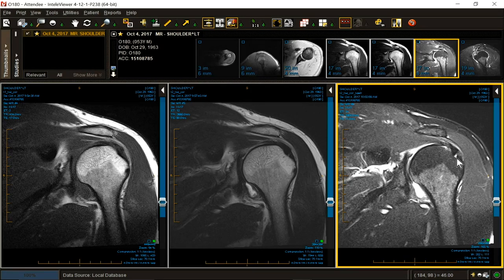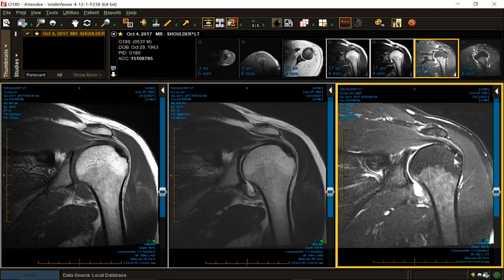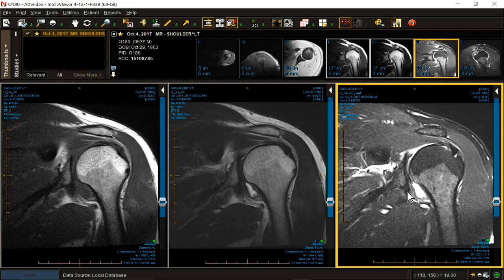Is it symptomatic? I think not. Is it surgical? I think not. So I might say, incidentally noted, is a 2 by 2 millimeter concealed interstitial delamination micro tear of the infraspinatus. Do we think that tear is causing all this? I think not.